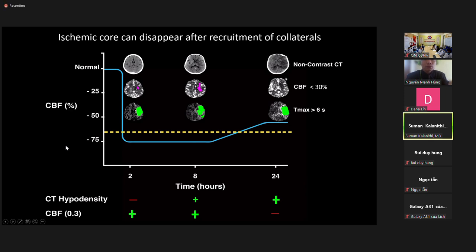Okay, so you may see this sometimes where you see an obvious stroke, an old or a new one, and then at less than 30% you see nothing, and you're like, oh, RAPID's not working, what's happening? But it's just because of these strange blood flow phenomena. And the simple rule is whenever you see this, doesn't matter about this, just go with your non-contrast head CT. So that's really important, because people in the United States, some sites are fine, but some people got really confused about that. So that's important. Does that make sense?